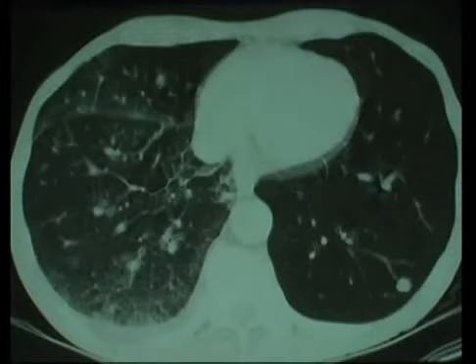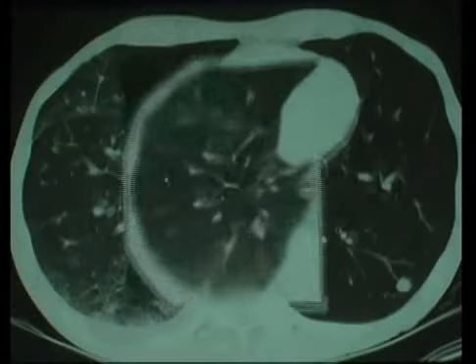So what do you see? Well, you see nodules, because this is hematogenous and lymphatic disease. Here's a nice vessel leading right into that. But what you see is haziness here and in these lymphatics. And now you start to pick out secondary lobules real quickly. And the reason you can pick out secondary lobules is because the lobular septa are thickened with tumor. So if you look carefully, what strikes you here, there is haziness, maybe even a little reticulation, but nodules and lymphatics, secondary lobular changes. Sometimes you can see these all the way from the periphery to the hilum, representing obstructed, tumor-filled lymphatics, edema in those lymphatics and perilymphatic spaces.